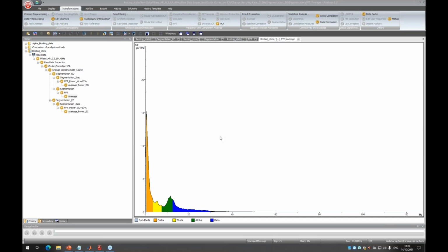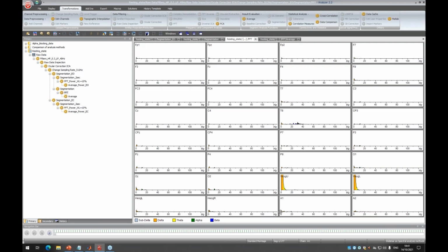Okay, thank you for the question. This question is closely related to the first question on the Welch method. When we were computing the Welch method, without knowing that, we actually already computed the so-called short time Fourier transform, because the short time Fourier transform is also usually performed on overlapping segments. So this FFT node here actually is a short time Fourier transform.